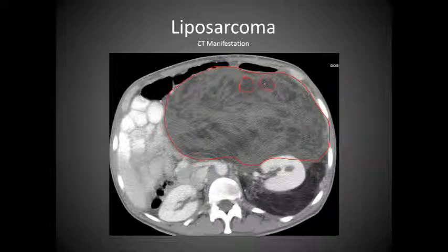And notice you have different attenuation factors on the inside. You have all these areas that I'm kind of circling that are less dense. And the reason we can say that they're less dense is because the grayer to black that something gets, we have almost the same density as air. And notice that this other tissue is much higher in density. It has a greater attenuation factor in it.